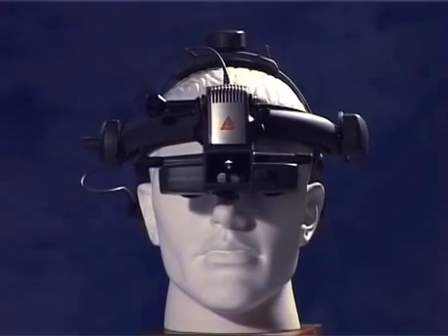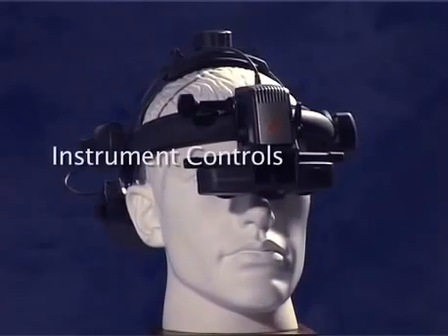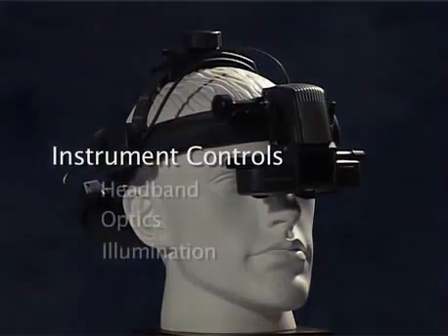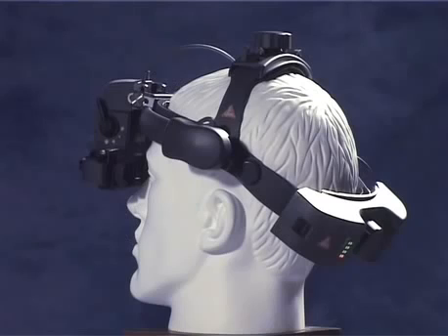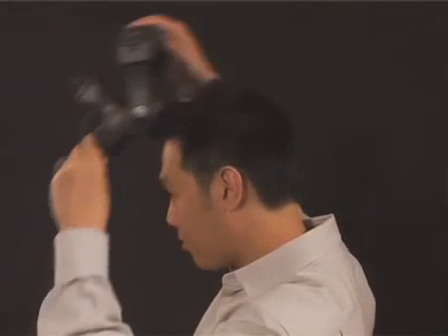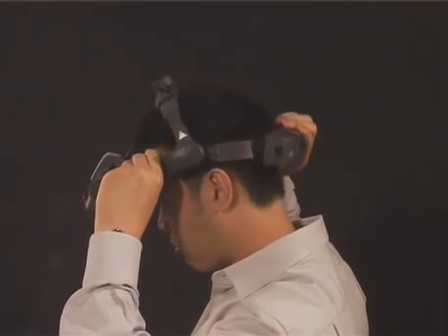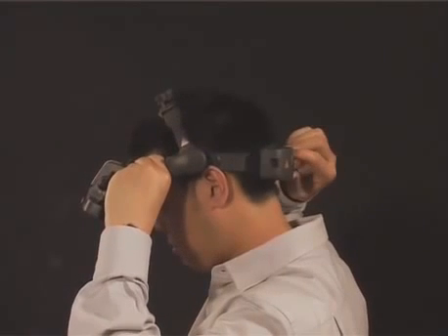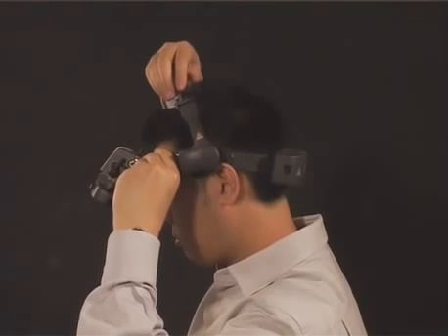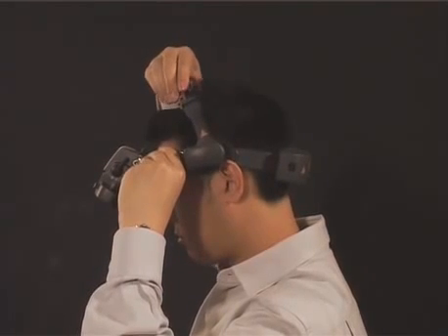Regardless of the manufacturer, all instruments share some standard basic features, which comprise an adjustable headband fitting, a customizable viewing system for the examiner, and controls for tailoring the illumination. The headband is adjusted for position and comfort using 2 knobs. The one at the back controls circumferential adjustment so that it rests firmly and comfortably with no unwanted movement when tilting the head. The knob at the top adjusts the vertical position of the instrument, which should rest just above your ears.